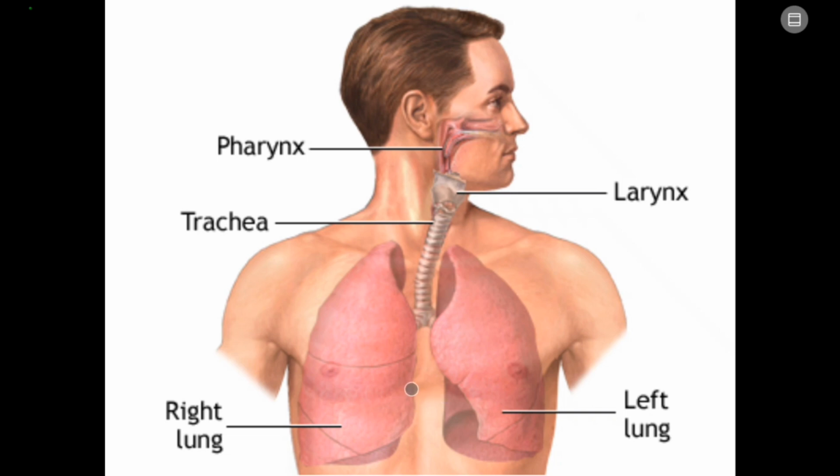The location of the middle lobe of the left lung would be here, but the heart takes this place. So the right lung is larger than the left lung, and the trachea enters the chest cavity and bifurcates in the lung. This is not our issue in this video, but our main topic is the lobar anatomy of the lung.